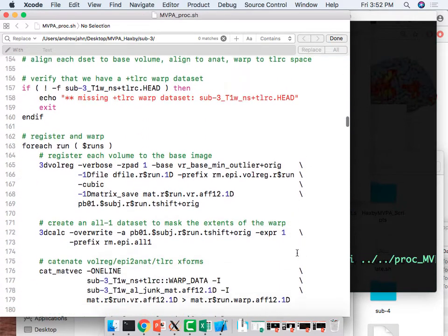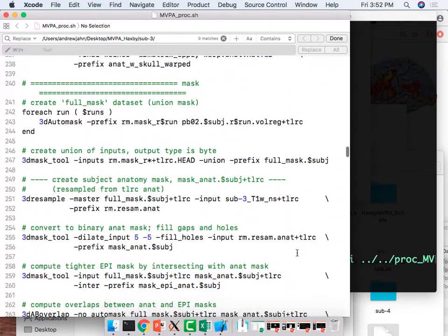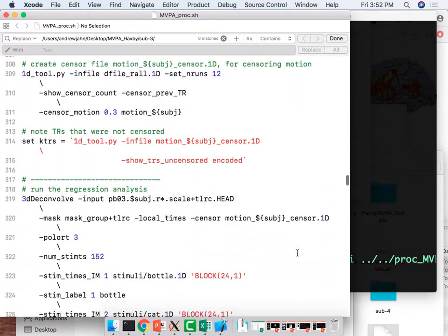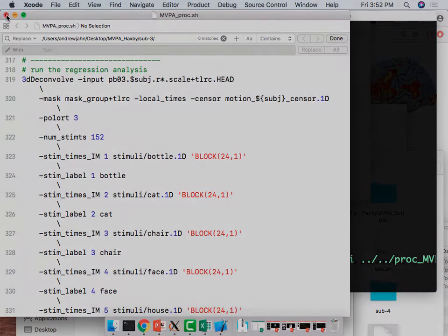Okay, in any case, I think that is good enough. I think we have everything we need. I'm trying to see if there are any other path issues which will make this fail. I don't think so. Okay, I'm going to upload this.